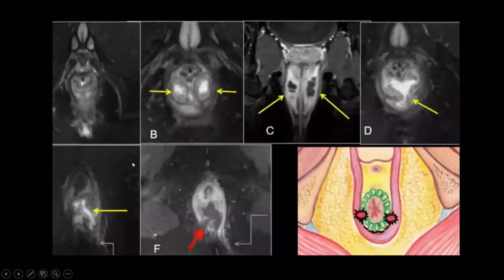What do we have here? Two abscess-like tracts. So two widened tracts, again lying in the intersphincteric space. This is the axial image. You can see them even in coronal, right? Bounded by the external sphincter on the outside, by the internal sphincter on the inside, and between the two lie two abscess-like tracts, which again merge and then open externally, seen well on the drawing.